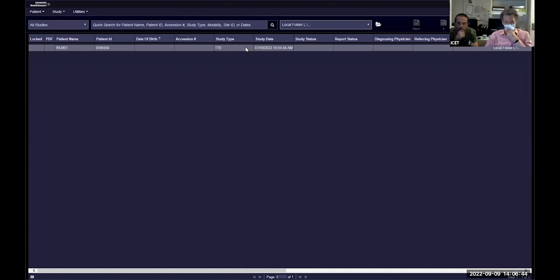I've got a series of parasternal long axis views with zoom in the bottom right and color Doppler over the bottom left. The two findings that bother me most are, one, normal to hyperkinetic contractile function in the basal segments of the anteroseptal and inferolateral wall, with the mid segments of the same walls probably hypokinetic.